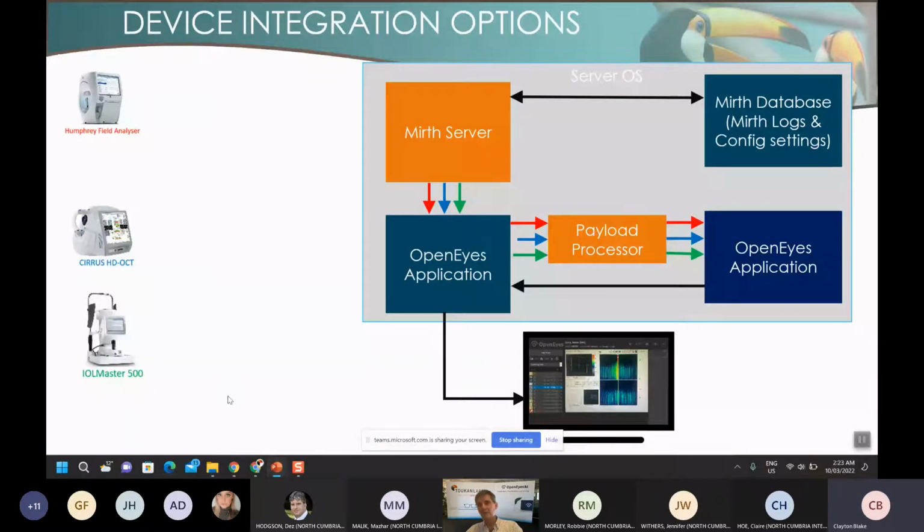Just to clarify on that, we've got an interoperability guide that gives you the detail, but at a high level, we import the imagery, the PDF, and we don't do the actual cube. So the full cube video is not put in. However, we do import the slices. So if you remember that visual acuity stuff that you saw from the demo before, you can actually link that to all the slices, and as you scroll backwards and forwards across the graph, you'll see the imagery change on the right hand side. So it looks very much like a cube, but it's actually the transition of the eye over time.